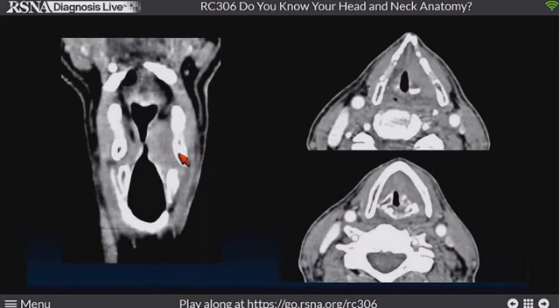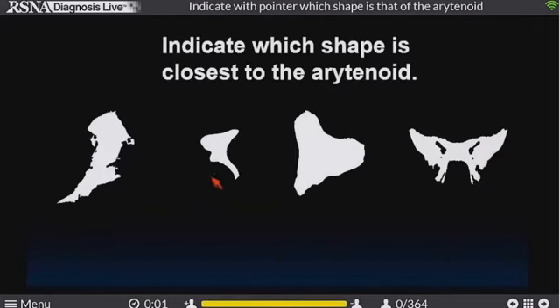Now this particular case, you'll notice, was actually thought to be relatively small, but the clinician, when they looked in with their endoscopes, said there was a supraglottic bulge, and look how it's come down, filled this entire space, and escaped out between thyroid cartilage and the cricoid. This is actually not much of a barrier. Some of the other things are, but if it can get through into the paraglottic region, it can leak right out extralaryngeal. We'll get back to this.